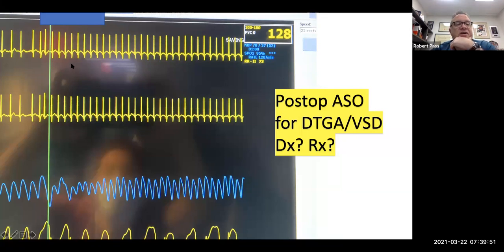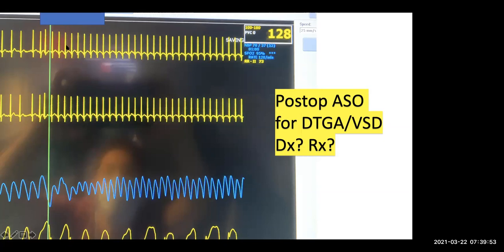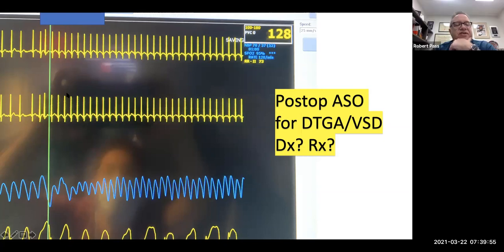But I think it is pretty clear that there appears to be a relatively sudden onset of tachycardia. We don't actually have the rate, but it's probably in the range of about 200 beats per minute. And I agree with you. Normally if we see a sudden onset tachycardia like this, we might think of a reentrant arrhythmia.